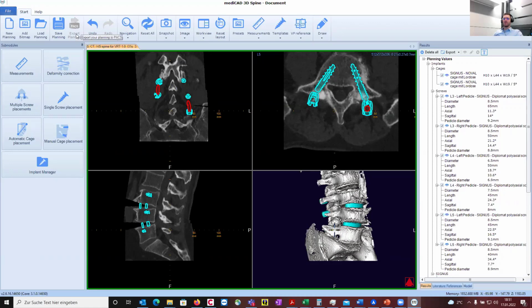It should be gray as well when you're now in the module, because I think you don't have any access to a PACS system. Yeah, but this is possible. So when we install the software on your system or in your hospital, you normally have this possibility or this functionality. So this is one possibility to treat something like that.